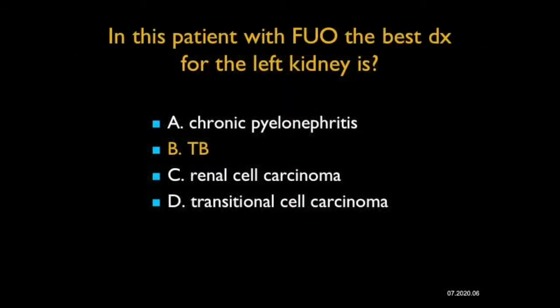This is a great example of tuberculosis. Very nice atrophic kidney, linear calcifications. Sometimes with TB, you could see strictures in the ureter, strictures in the renal pelvis, calyceal strictures, papillary necrosis, and even a small non-functioning atrophic calcified kidney. TB is rare, but it does occur, and this was one very nice example.